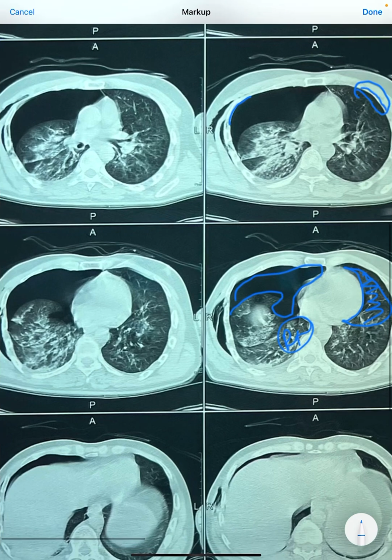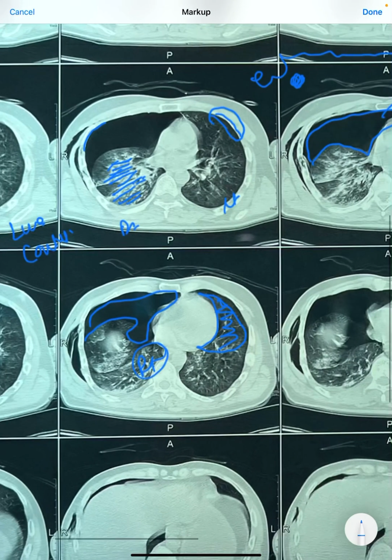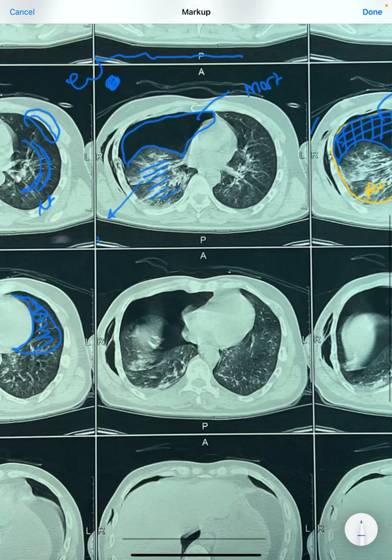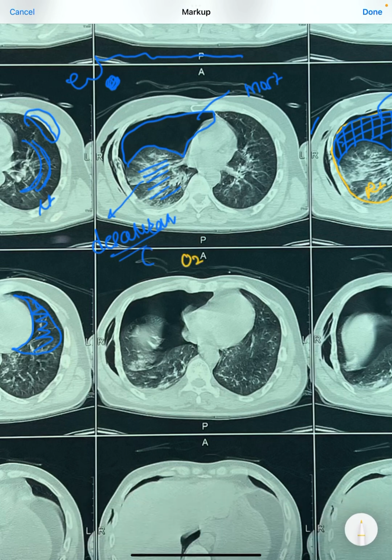And you can see, just compare the left lung and the right lung, there is so much hyperdense or whitish lining present, which typically tells that this lung has contusional injury. Whenever the lung gets injured, whenever the lung gets blunt trauma, the radiolucency of the lung reduces and you get radio-opaque white lines. It presents with desaturation, because this lung will not contribute to oxygenation. So the oxygenation of the patient may reduce.